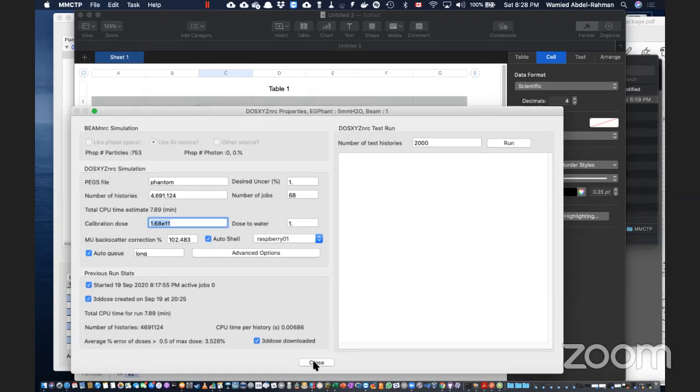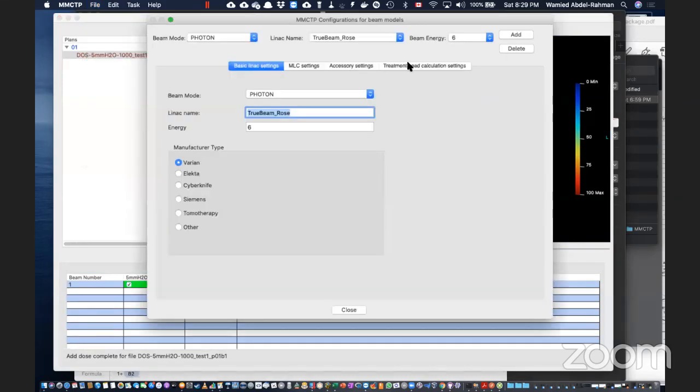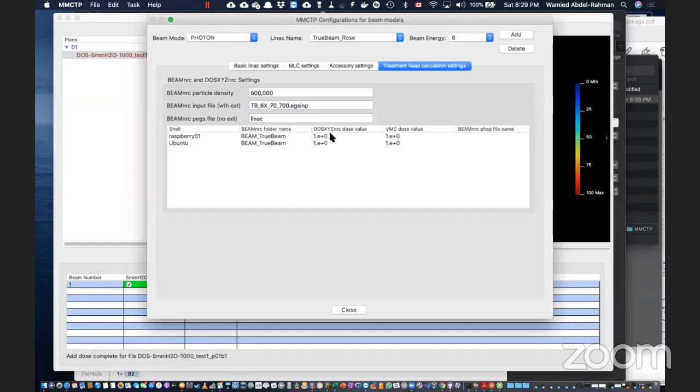Okay, so if I want to change this permanently, we probably need to go to the configuration, those XYZ. So in beam models, the beam models associated to your Linac. Yes, so it's right there. I'm going to warn you though, the number that you're entering may be off by 100. Fine, but if I'm doing this simulation properly, I would just run a lot more particles. Right.